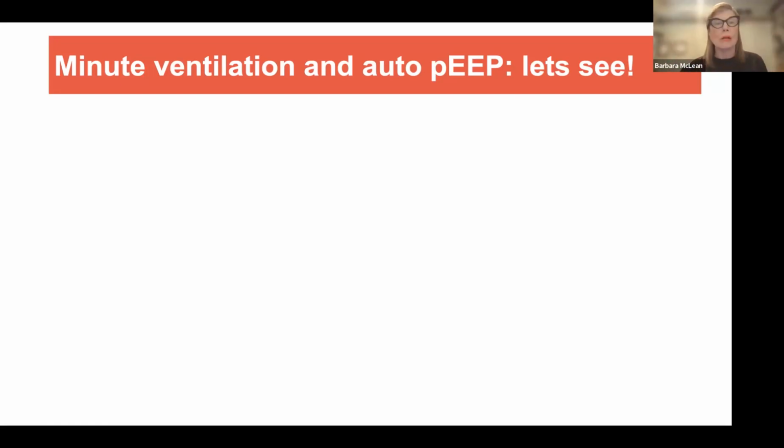Let's see what that's all about by using our simulators we've worked through before, and also appreciating that I have to work hard with the simulator. The simulator is known as X-Lung. It is a fantastic simulator that helps us to understand the dynamics of lung ventilation. I don't understand all the ins and outs of the simulator, but I do feel that it is helpful to use it to basically look at some concepts.